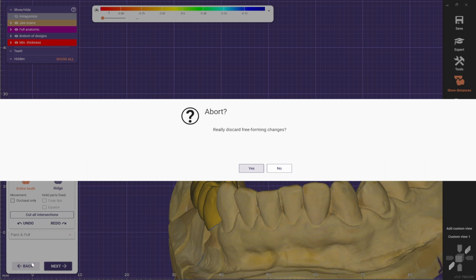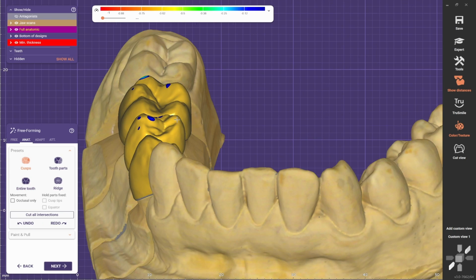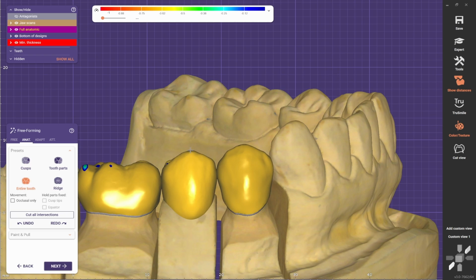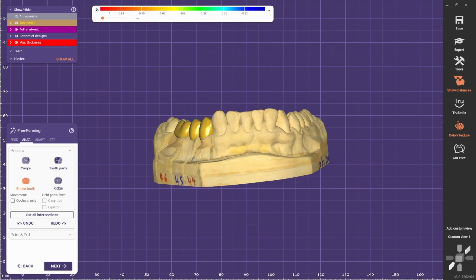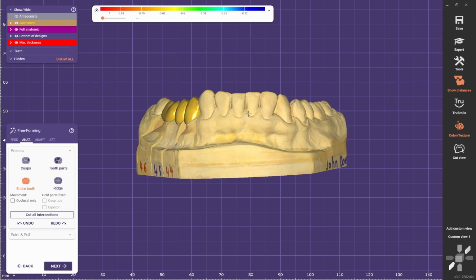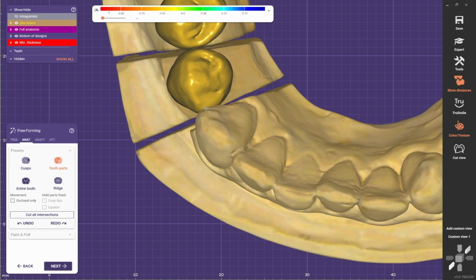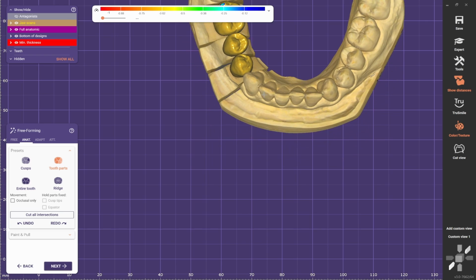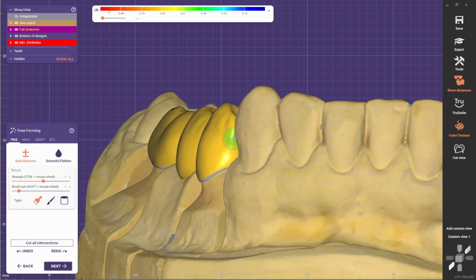Probably was a bit too much, so go undo. Use the entire tooth. Here a bit, a little bit here. So I'm trying to make it slowly and carefully, just not to distort all the anatomy, just to resemble the other one. Okay. You could even bring out the mesial side a bit out, like you have on the 34. You can just play around.